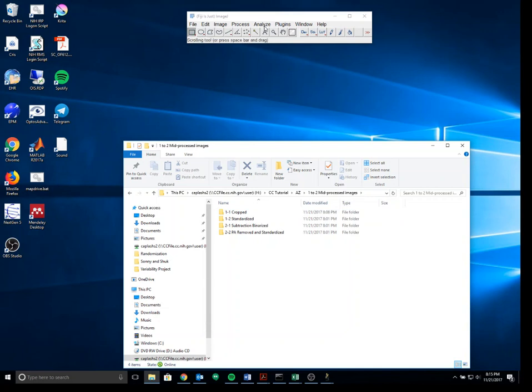Now, a quick review of vascular anatomy in the retina will say that you have your superficial, deep, and then avascular, and then choriocapillaris, all sort of layered on top of each other. And so sometimes, as the OCT-A is collecting its image, it might sort of project shadows of overlying vessels onto underlying layers.